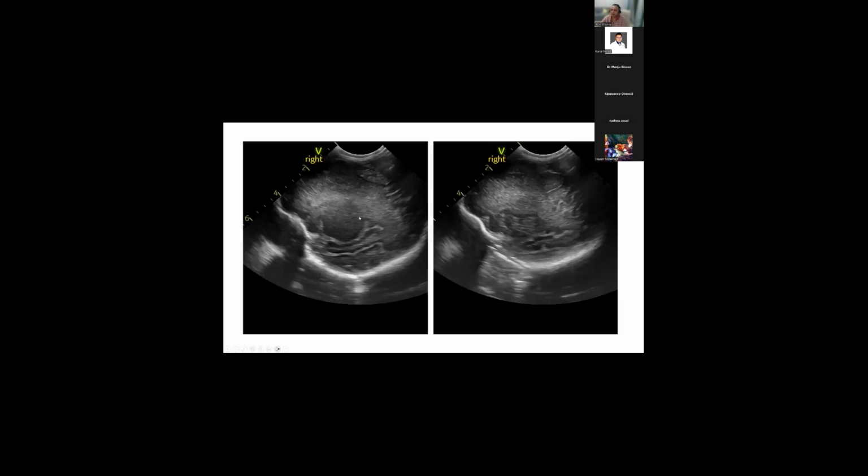This is the right lateral parasagittal view, cerebral hemispheres with the temporal lobe, as you can see over here. This is what fissure? Sylvian fissure. Yeah. And what is this called? The insula. Yes.